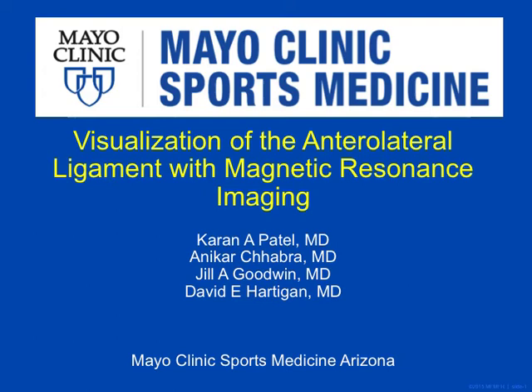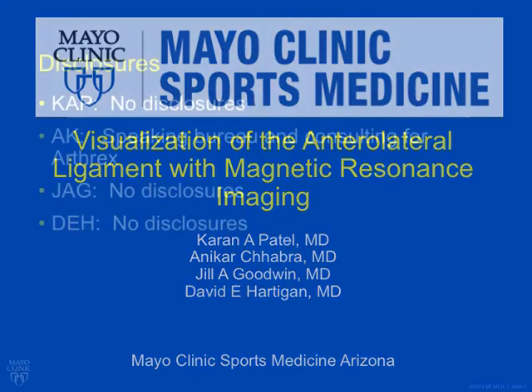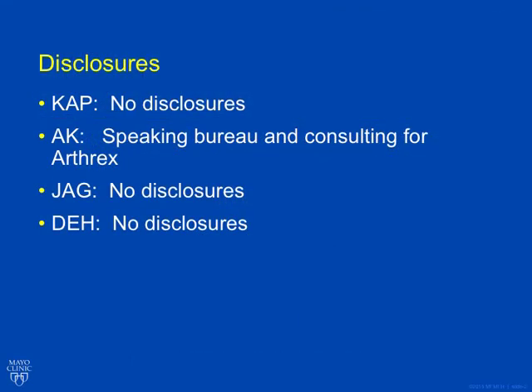Today we're going to be giving a technique guide for visualization of the anterolateral ligament with magnetic resonance imaging. We have no pertinent disclosures to this technique.